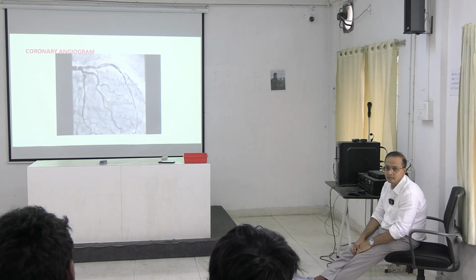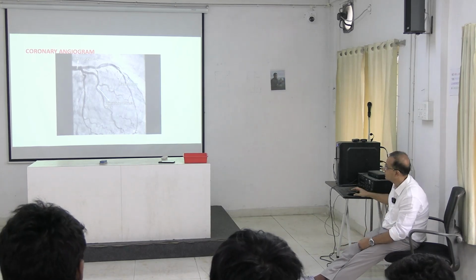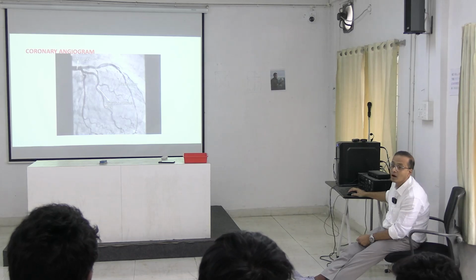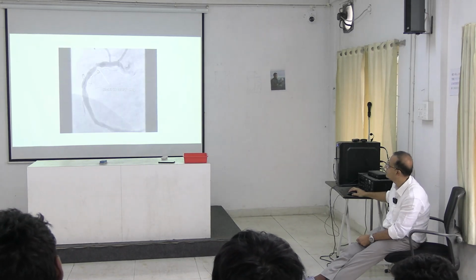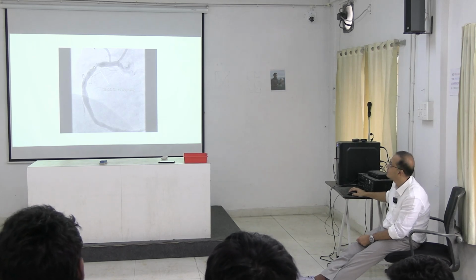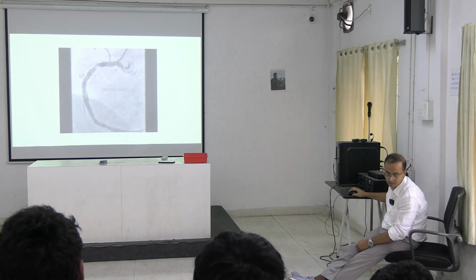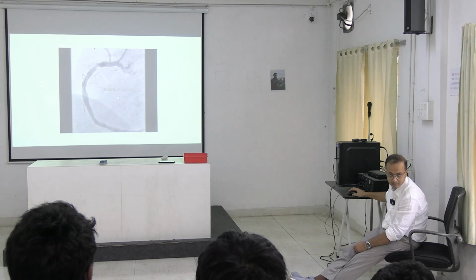Now see, what are you going to see? The branching of vessels on the heart. This is an artery which you are seeing here. The branches of the arteries present in the heart, which you are seeing here, we call coronary arteriogram. And this is a normal coronary arteriogram. In here you can see that there is an obstruction or block. The lumen is narrowed because of something accumulated in here, and blood cannot flow through it. The individual may experience pain in the chest while walking or doing something. So this is how we see a blocked coronary artery. It should look like this.